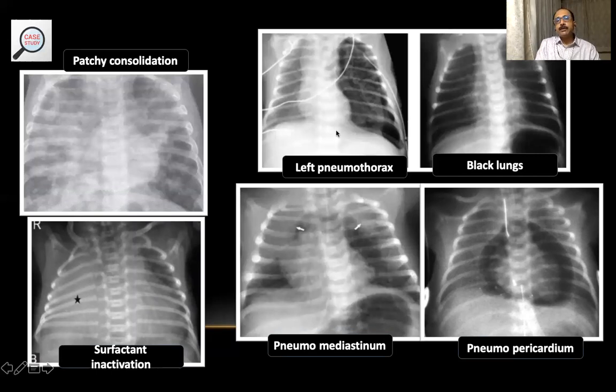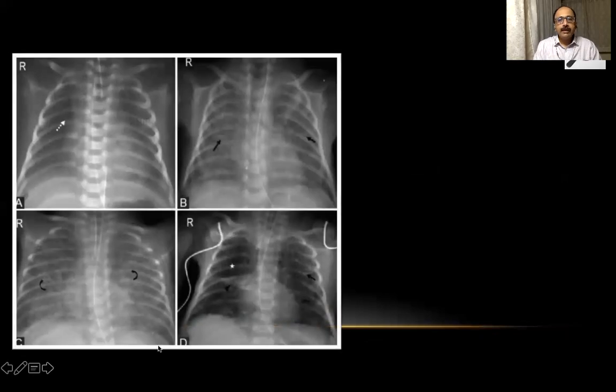A good way to substitute an X-ray to pick up a pneumothorax is to use transillumination bedside, and obviously you need to darken the room otherwise. So to summarize, meconium aspiration syndrome has normal to increased lung volumes, and the lesion may be asymmetric, diffuse, non-homogeneous, patchy consolidation, and this newborn is at risk for multiple complications, of which we just talked about.